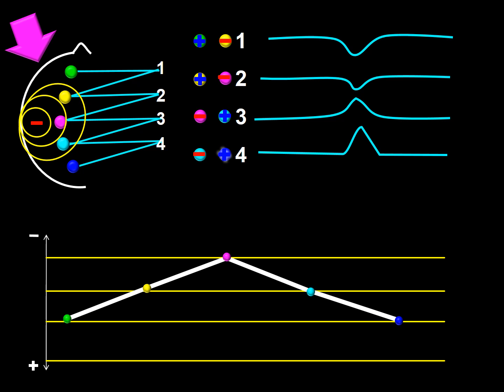Now look at this new frame. The only change that has taken place in the isopotential map is that now the voltage source is to the left of the magenta electrode. But also notice that neither the tracing nor the polarity graph have changed. The same occurs in this new frame. When the maximal in the isopotential map has changed, as you can see, the magenta electrode is now to the left of the maxima, but neither the tracing nor the polarity graph has changed.